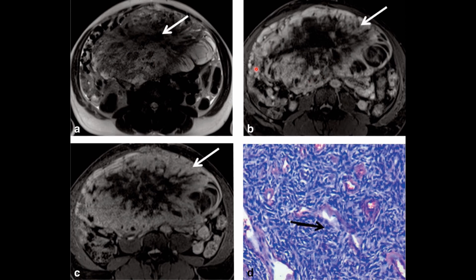So when I come to the arterial enhancement, it is showing areas of enhancement, but in the center it is showing areas of hypointensity, suggesting a very fibrous tumor. Now, if you see in the delayed images, again the persistent hyperenhancement is present. That means that fibrous tissue will retain the contrast, and that's what we see here. So this is a case of solitary fibrous tumor.